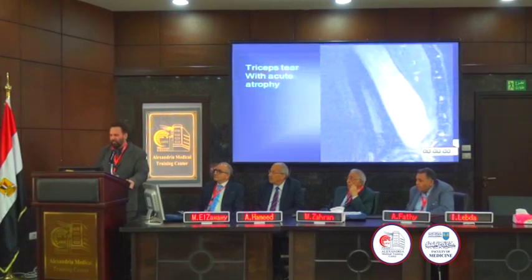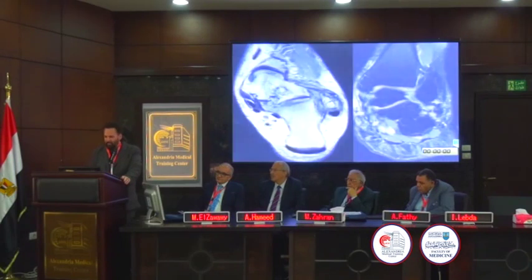And that happens in a surprising number of cases. I think one gentleman asked me about this yesterday in the hallway. You can have a tendon that looks almost normal and does not do its job at all, and that's when it loses that hierarchical organization. So this patient had a triceps tendon tear. This is a T2-weighted image. We see acute edema. It's an acute tear. Good prognosis. It is repairable. Another triceps tear, but fatty infiltration of the triceps. Irreparable. Never get the function back.